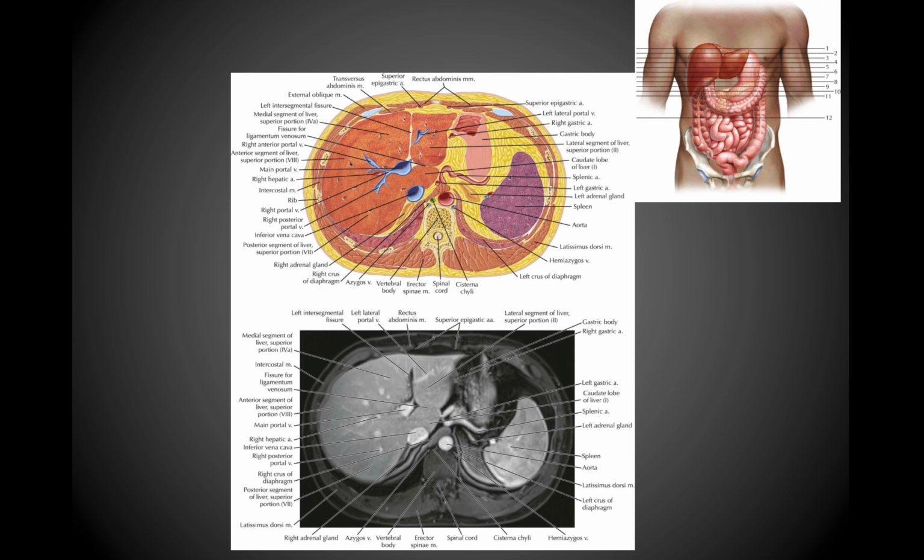Moving to the next image now, we have a much better view of the splenic artery. So this right here is representing the splenic artery going over towards the spleen, which once again you can see quite well. You can see the muscle layers of the diaphragm kind of looks like they're almost draping off of the aorta. Here's the IVC again, just posterior to the caudate lobe.